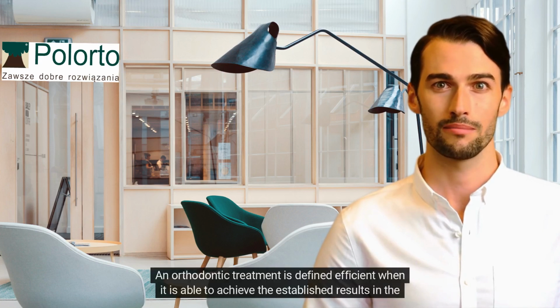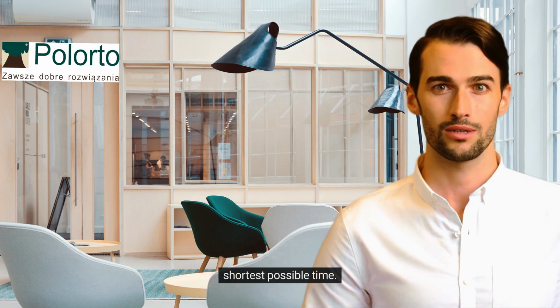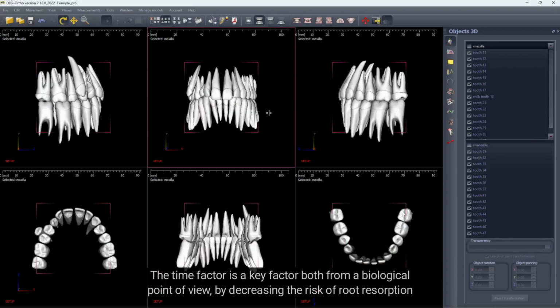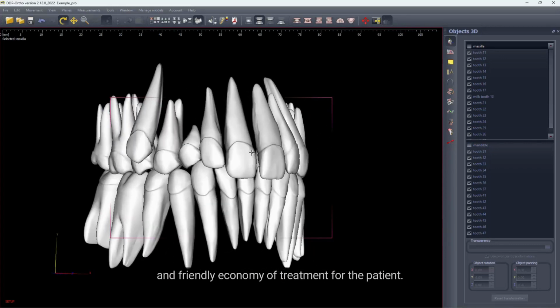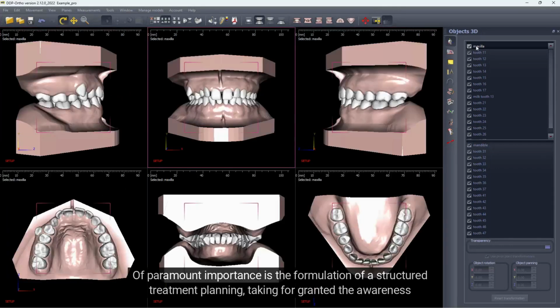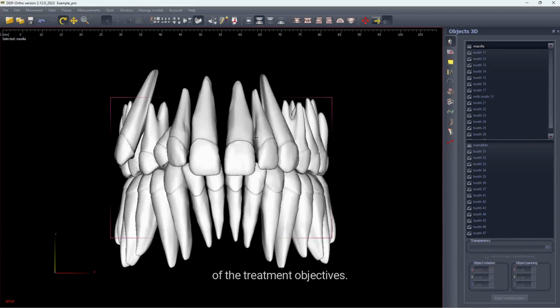An orthodontic treatment is defined as efficient when it is able to achieve the established results in the shortest possible time. The time factor is a key factor, both from a biological point of view, by decreasing the risk of root resorption, and from an economic point of view for the patient. Of paramount importance is the formulation of a structured treatment plan, taking for granted the awareness of the treatment objectives.